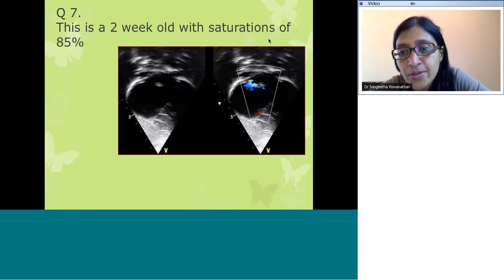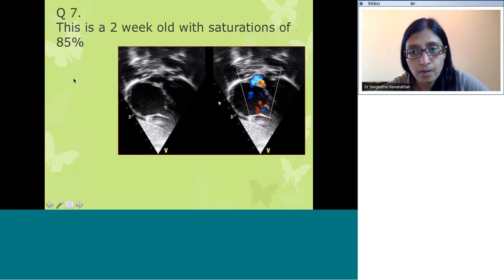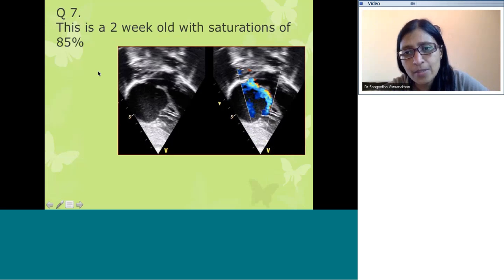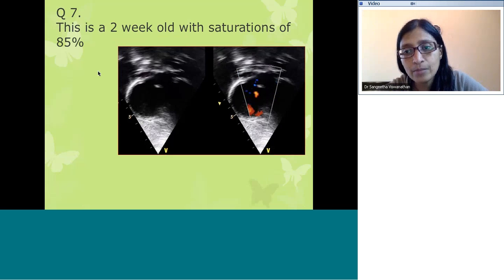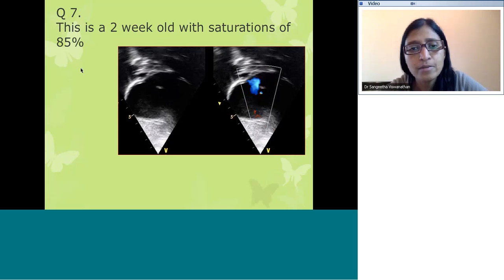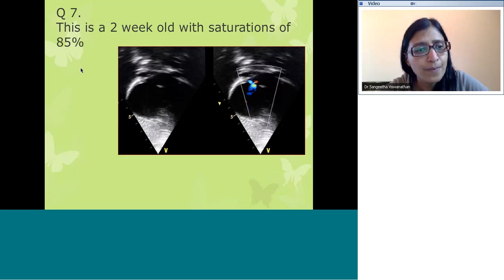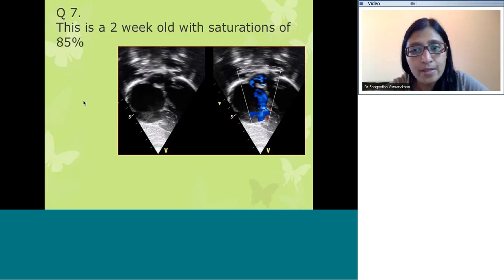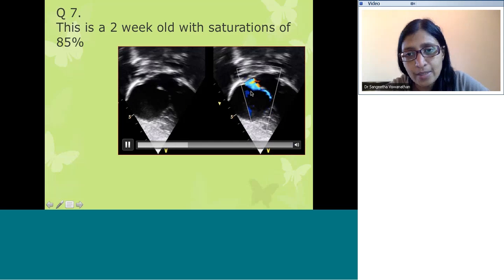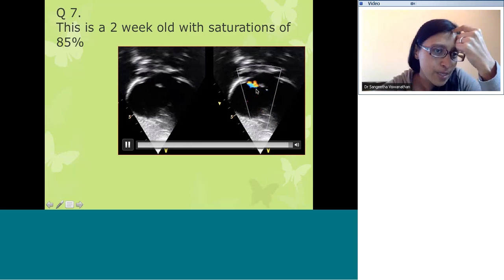Why do you think the saturations are 85%? Okay, Sangeeta, tell me why you're telling me this is TAPVC. Right. I accept ASD right to left, TR jet to LA through ASD. I'm not entirely sure just from this one clip we are able to say yes.